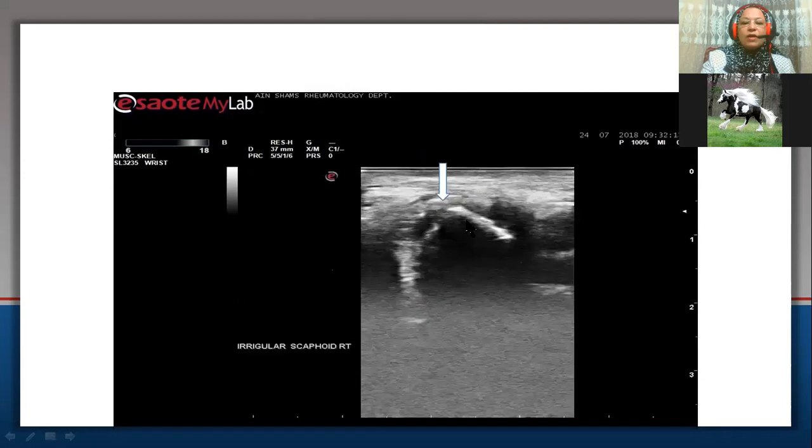On examination of his right wrist volar side, there was abnormality at the scaphoid bone. The bone contour was abnormal, hazy, not apparent, which indicates the presence of pathology at the right scaphoid bone.